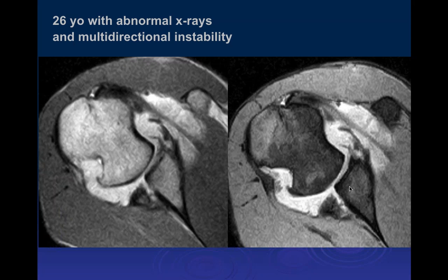Do you call this a fracture? It looks like there's a piece of bone that's been pulled off, like on the T1 image. Yeah, looks like a piece of bone. Well, there's something that's somewhat corticated along the posterior. It looks like a fracture.